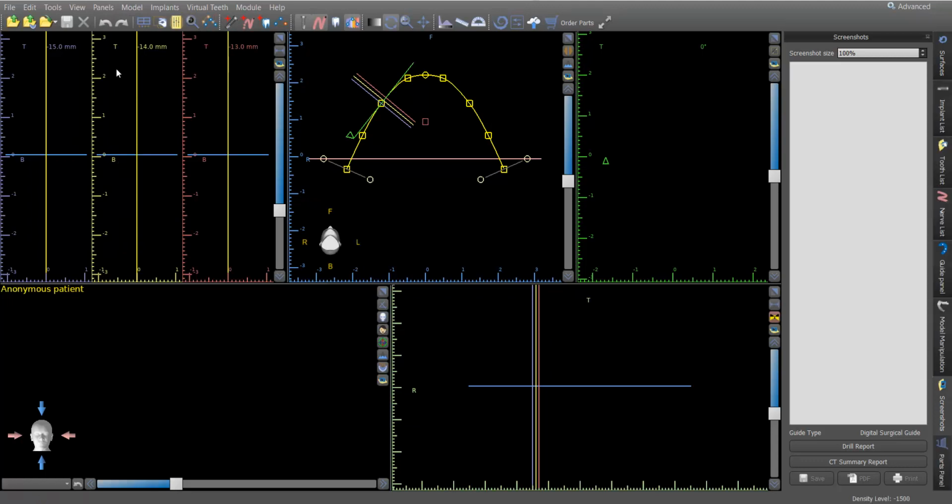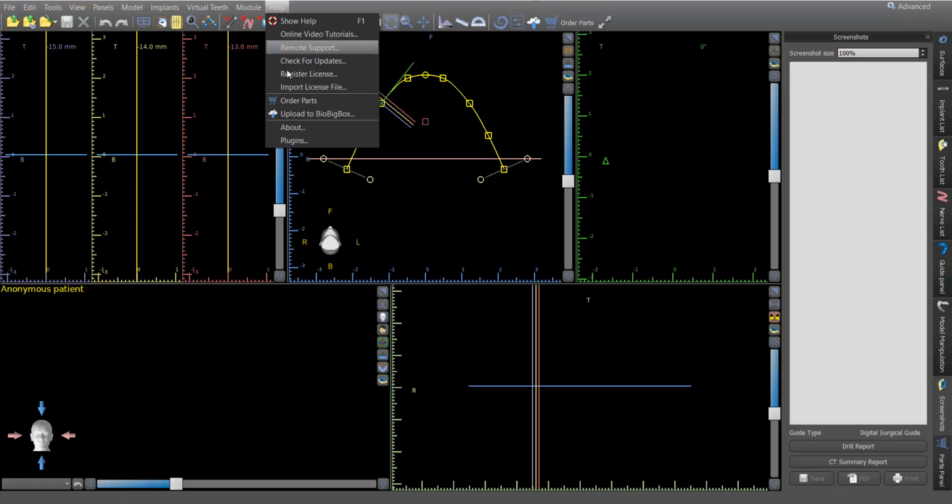So, continuing along, again, these tools right here: adding teeth, removing teeth, replacing teeth. The add tooth function is right here, which, I never use this menu, but just so you know it's there. This right here is the same thing as what's over here. I would recommend sticking with this one just to help you realize it's always separate over there. And then your help functions. If you ever want to see if there's an update for the software, you can click here.